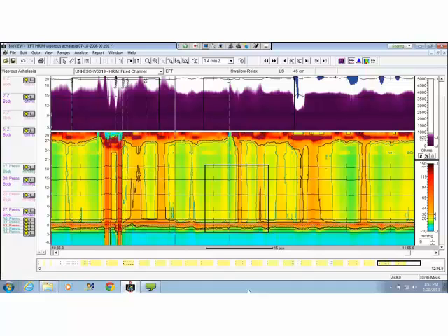Okay. If you have multiple contractions, not necessarily achalasia, what would you do in that case? The same would apply. I would follow the primary contraction wave off the striated muscle from the opening of the UES. I would follow that down and measure that.